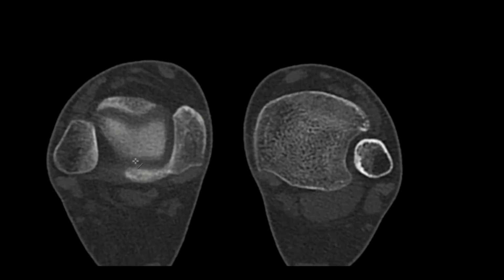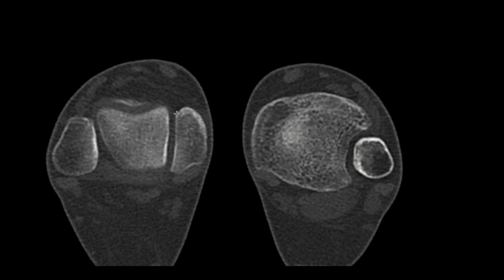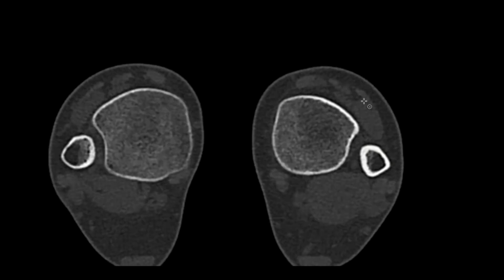Next up, we need to measure the amount of tibial rotation at the level of the ankle. Here we have basically two options. The first type of measurement was described by Goutelier. You scroll down to a slice that cuts just through the most proximal aspect of the talus, such as this slice here, and then you draw a line at the articular aspect of the medial and the lateral malleolus, as you can see here. Then you draw an interconnecting line between the two midpoints of these lines and measure the angle again to our reference line. So the angle is roughly 2 degrees in this case.